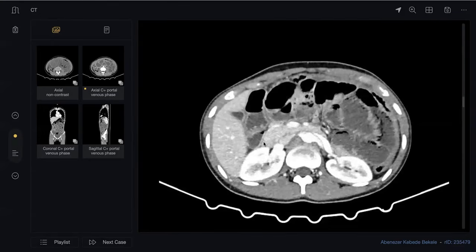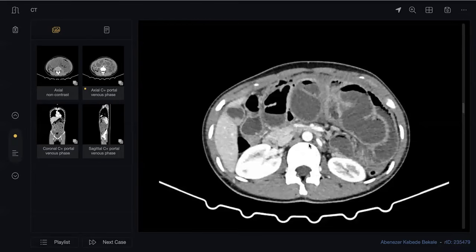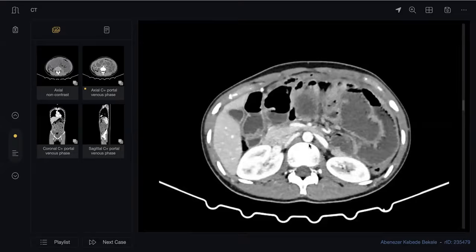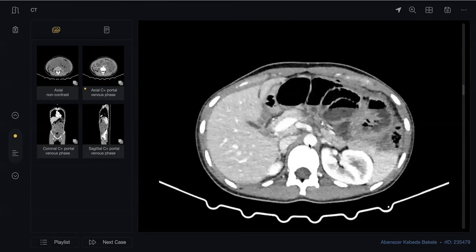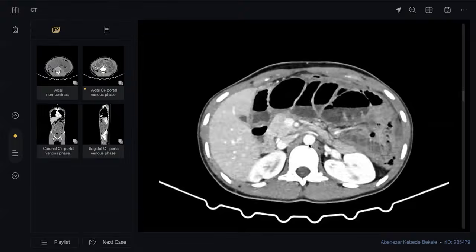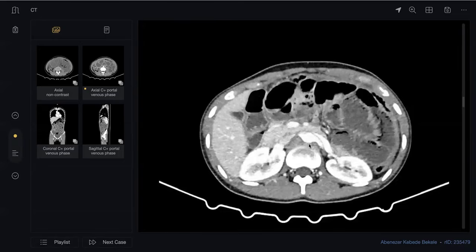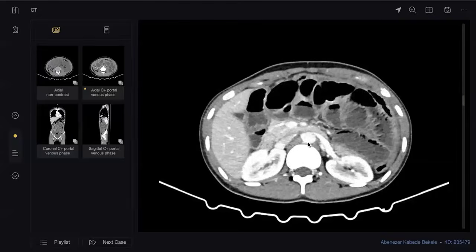One thought which comes to my mind for these clustered bowel loops is internal hernia. There is no internal hernia. Okay, so the possibility could be a closed loop obstruction secondary to underlying adhesions, secondary to a previous infective process. Okay, I will look into the coronal images. Yes, look at the coronal.